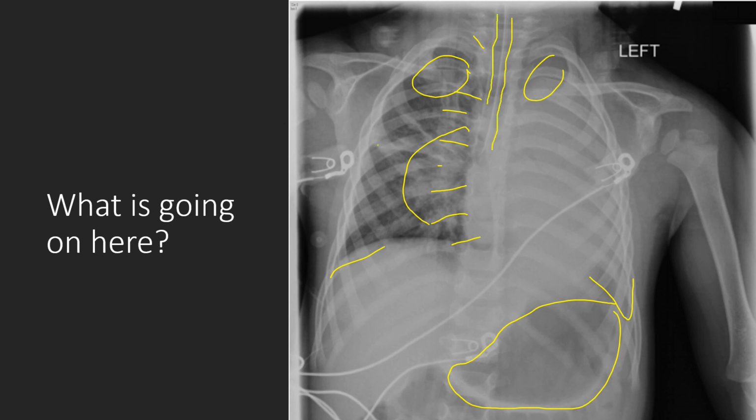This is the endotracheal tube. It has a radiopaque line on it. And this is supposed to be, here, let's use a different color. Let's use green. This is supposed to be the carina. What do you notice about that yellow line? It goes into the right mainstem bronchus. So this is a right mainstem intubation. So the ET tube got inserted into the right mainstem, which means there's no gas that's going into the left lung whatsoever. So the big thing here would be to pull back.